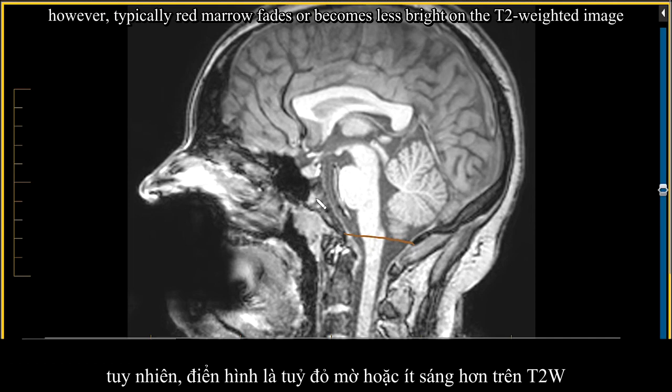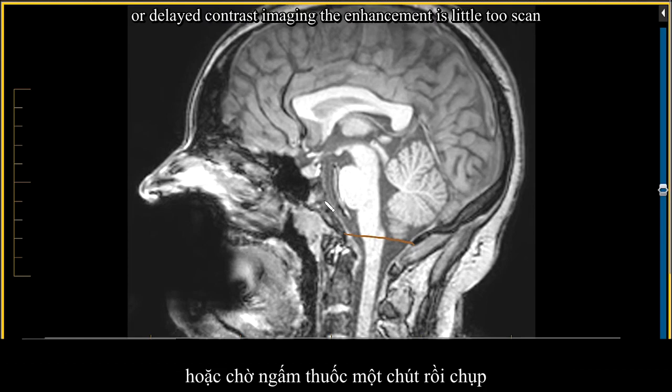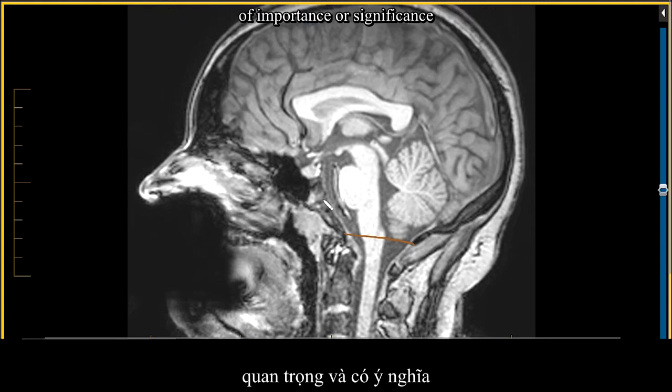However, typically, red marrow fades or becomes less bright on the T2 weighted image, and when you inject it and do first-pass imaging or delayed contrast imaging, the enhancement is little to scant, and that will help you differentiate it from something of importance or significance.